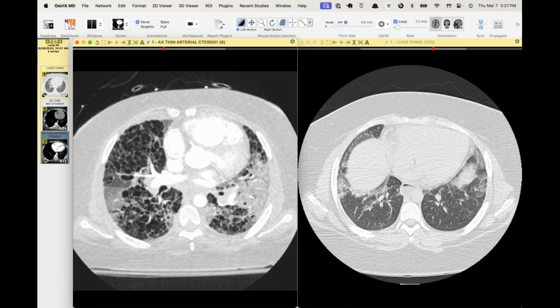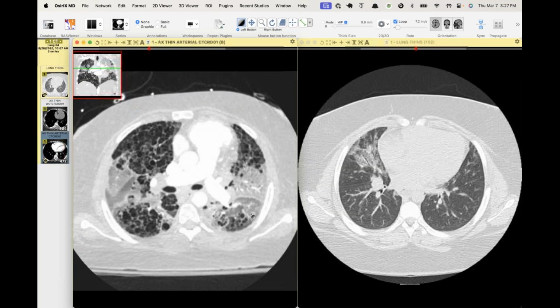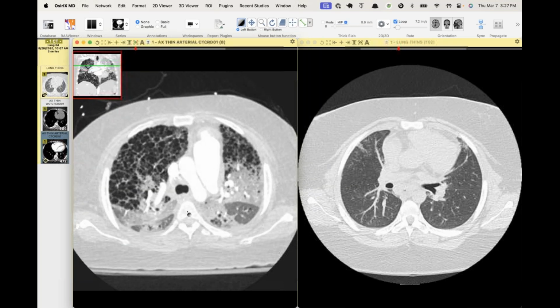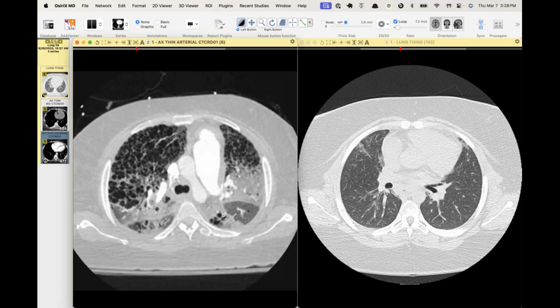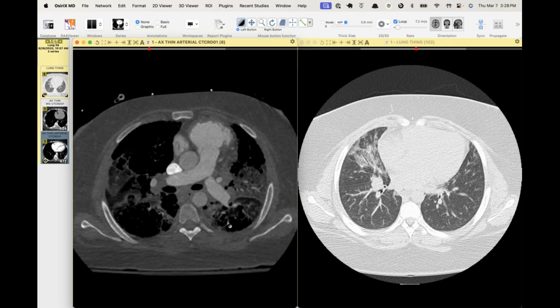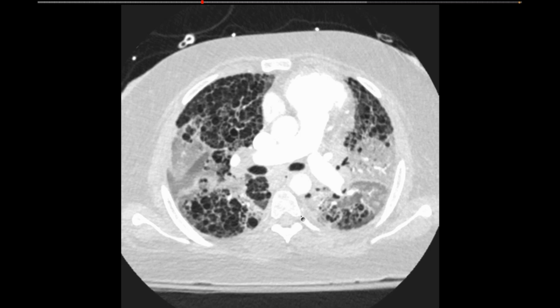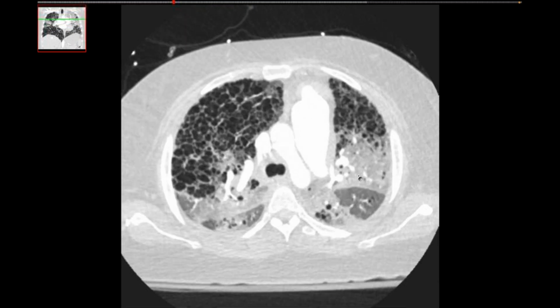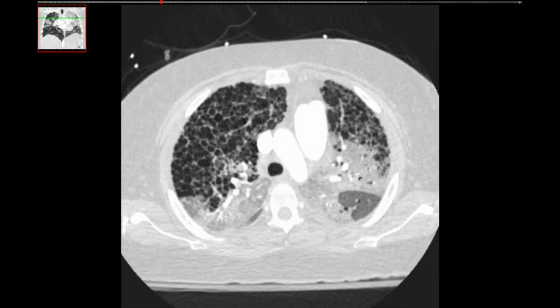I don't know if this is an acute exacerbation. I hope it's not a mucinous adenocarcinoma just involving what's left of her lung parenchyma, but I think some of the attenuation may just be from shunting of contrast as well. I just thought this was such an interesting appearance, though, that I had not quite seen before. It's almost like I was saying, a pseudo exogenous lipoid pneumonia look to that lung parenchyma. What do you guys think?